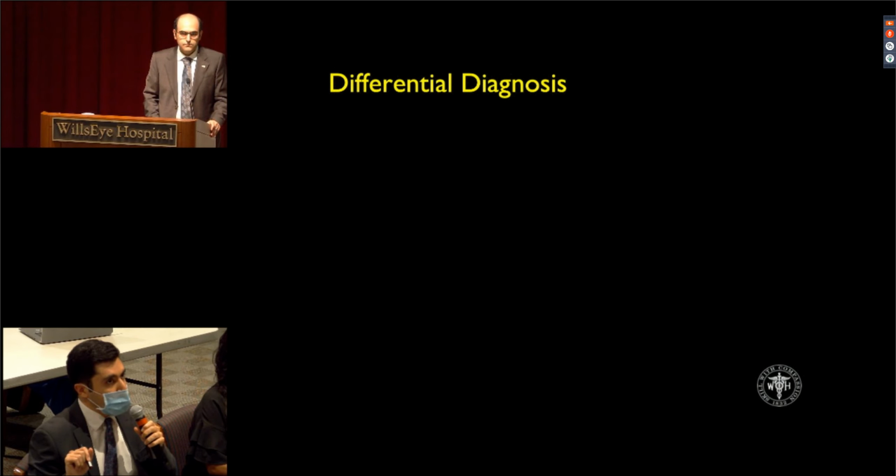So just broadly speaking, viral retinitis with those whitish appearing lesions, the OCT doesn't support that. Toxoplasmosis, similar, but again, no full thickness retinal involvement on the OCT. Syphilis is something that I would definitely want to rule out, especially given the outer retinal changes you're seeing on the OCT here. And then TB is something that I would definitely test for in this patient to rule out.